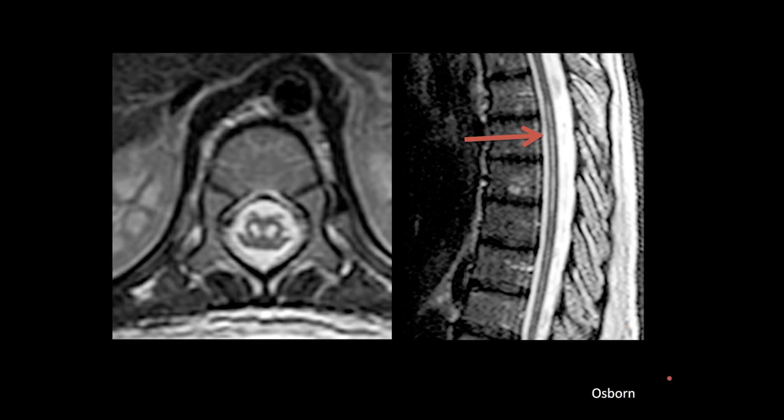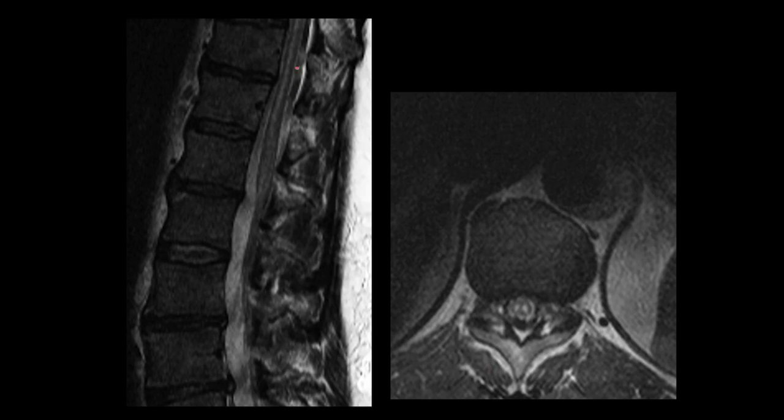Look at this example in which we see abnormal signal within the thoracolumbar spine, and you see on the axial view how this is a typical appearance of the owl's eye. In this other example, again, abnormal signal in the lower spinal cord, owl's eye appearance. What is interesting is that on the same image, you can also recognize a dissection, which is likely a dissection of the aorta, which is likely the cause of this infarct.